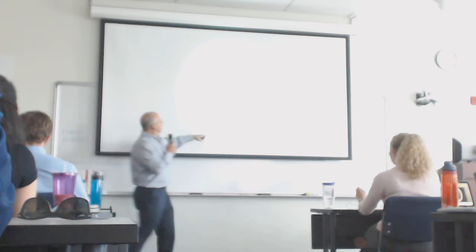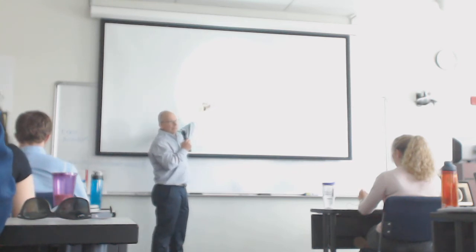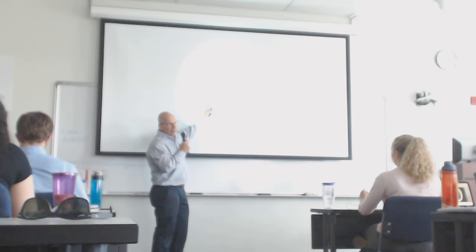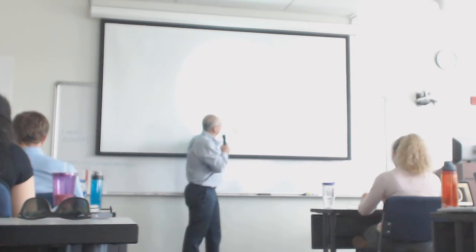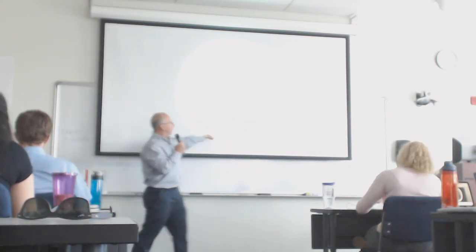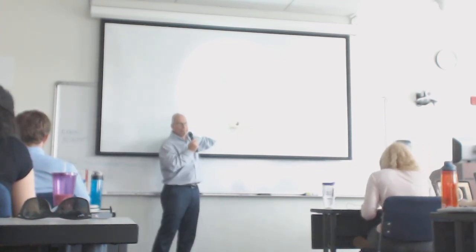So here's the normal brain. These ventricles are normal for the patient's age. If I told you the patient was 70, that's normal ventricles for a 70-year-old. If I told you the patient was 20, I'd say, I don't know why they're so big, but that's normal for 70. But here's this area, which is definitely lower density than here. And so this is where the stroke is. This is where the blood clot is somewhere in there, blocking blood getting to that portion of the brain.